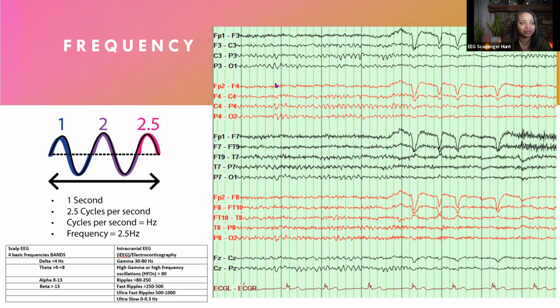Okay, so if you look at this EEG sample, you see your EKG leads left and right at the bottom here. These are your midline electrodes: frontal midline, central midline, and parietal midline. Convention from the American Clinical Neurophysiology Society is that you're going to have left over right. In our lab, we do left parasagittal over right parasagittal. Each line is called a channel. When you put these all together, this whole thing is known as a montage.